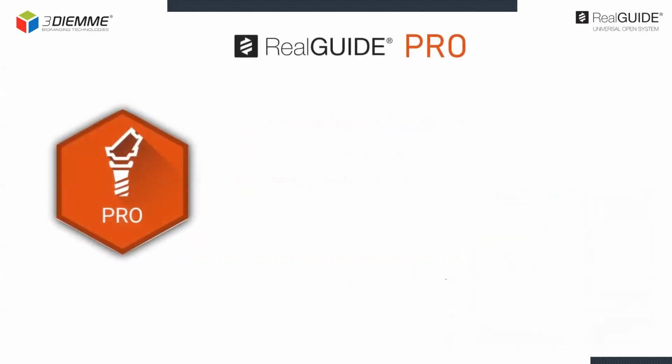The Pro module, which is dedicated to clinicians, in addition to the import of the DICOM dataset and the scan files, allows you to proceed with the implant planning using the main features here below.